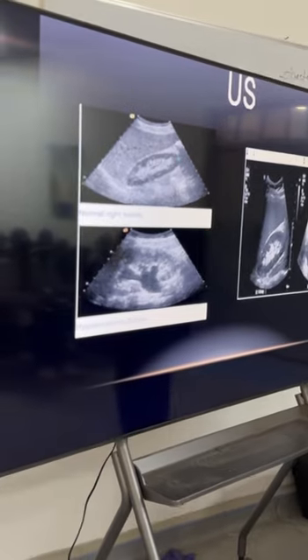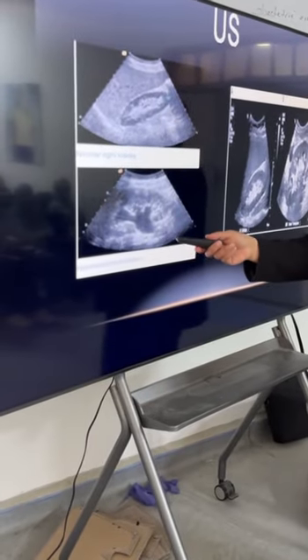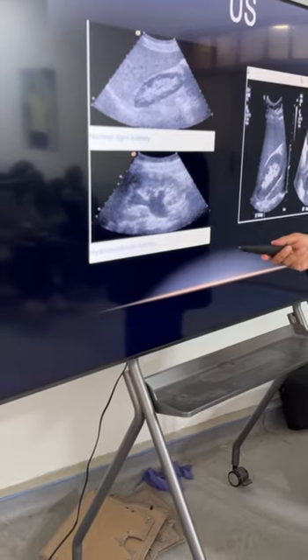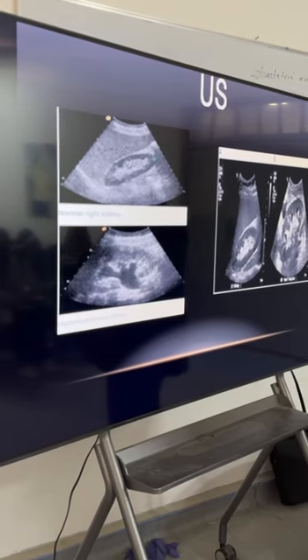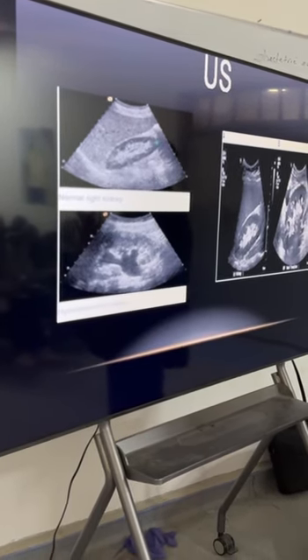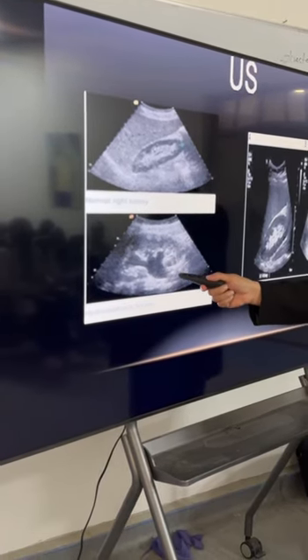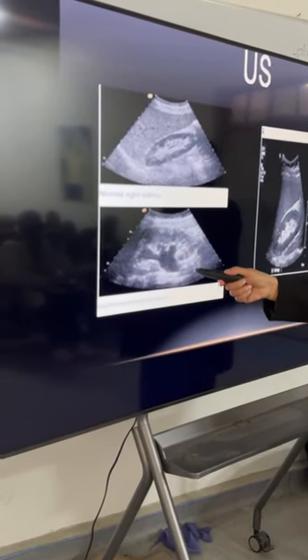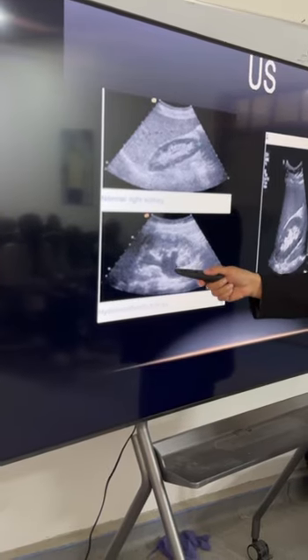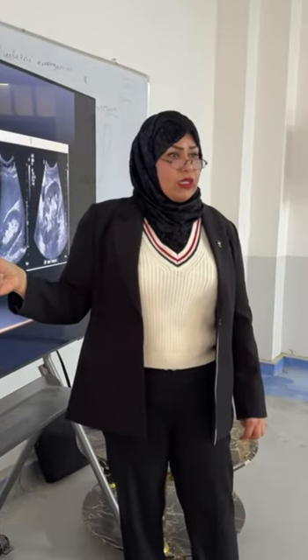While this, look for this. This is what we call hydronephrosis. It is a collection of urine inside the renal pelvis due to obstruction, due to any cause. Not just the stone is responsible for obstruction. But here in our images, this hyperechoic structure is regarded as a stone situated in the pelvic-ureteric junction. Can you assess which degree of hydronephrosis?